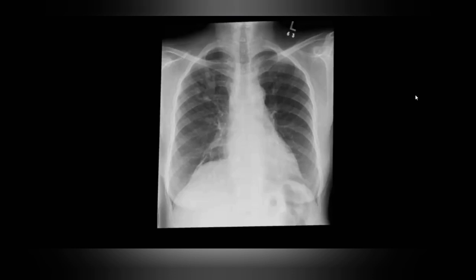It is not that I can say. It's typical of... if it would have been in the upper and middle lobes with the distant bronchiectasis, I would have thought of cystic fibrosis, and cystic fibrosis is a good differential, of course. And it can also be bronchial atresia. Excellent.